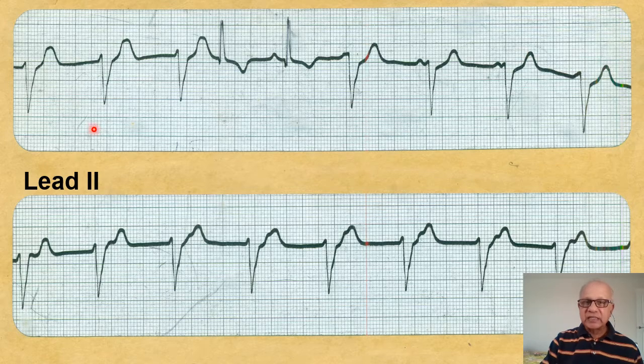So in this ECG, you have 3 types of QRS complexes. One is the accelerated idioventricular rhythm. The second is the sinus QRS complex. This is beating at a rate of 75 per minute. There are 4 large squares between these 2 R waves. So it is 75 per minute, which is faster than the idioventricular rhythm. And the third is the fusion beats.